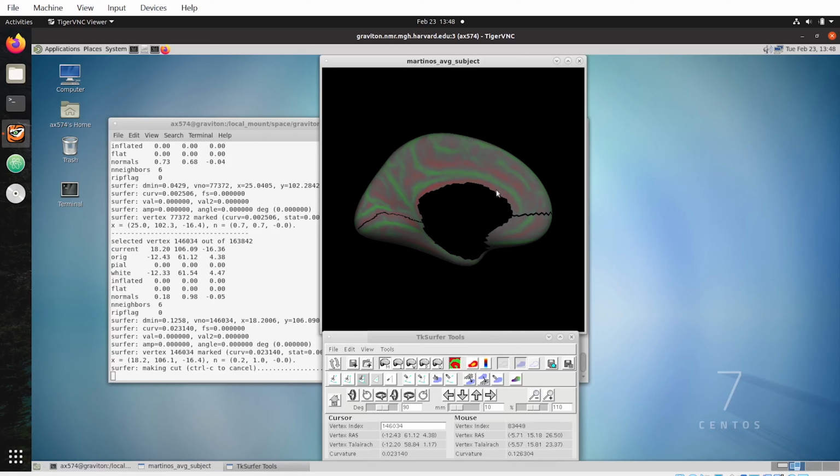Beautiful. Now I'll split the difference. So I'll try to take 1/3 across from here to here and 2/3 across to split the difference. No real rhyme or reason in particular.